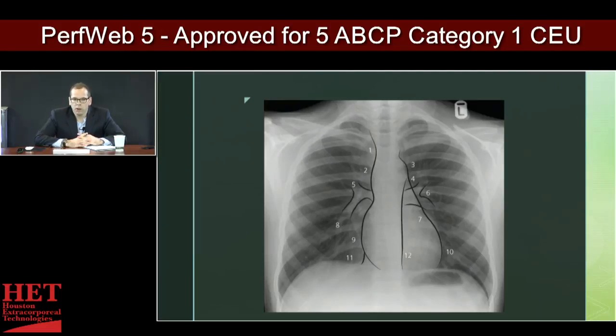And if you look at number one, that's going to be your innominate artery coming down, your superior vena cava, all in that region, which continues into number two. And then number three on your right-hand side of your screen is going to be the knob or the arch of the aorta as it makes that curve and heads posterior and then down along the vertebra down into the abdomen. Number four is what we would call kind of the left lateral border of the heart, or the upper mediastinum. And just below that, you see the pulmonary arteries and the veins.